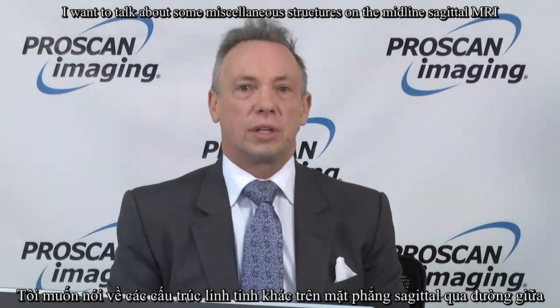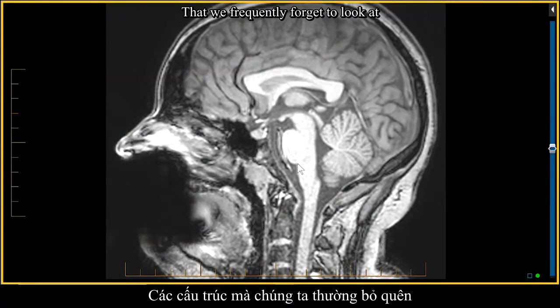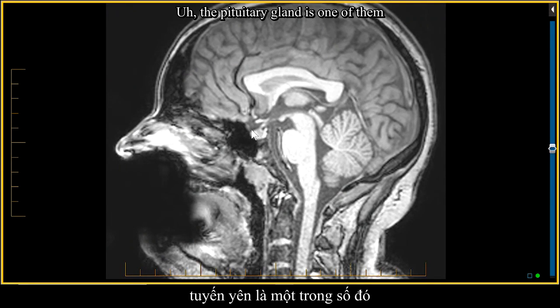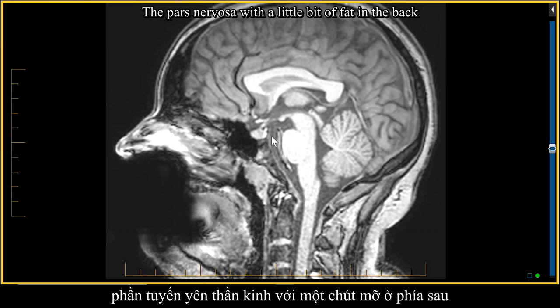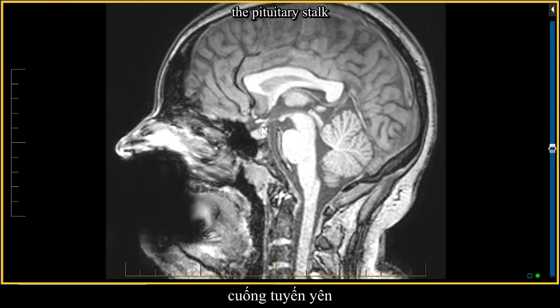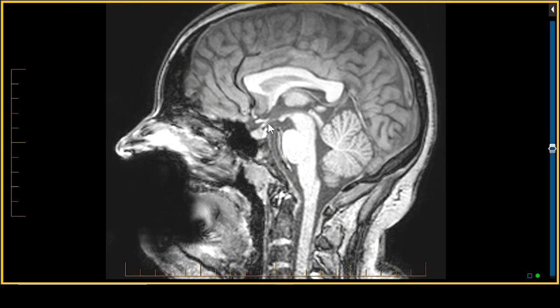I want to talk about some miscellaneous structures on the midline sagittal MR that we frequently forget to look at. The pituitary gland is one of them. We've got the adenohypophysis, or pars distalis, and pars intermedia right there. The pars nervosa with a little bit of fat in the back. The pituitary stalk, or pituitary infundibulum, and the median eminence as it comes up and fans out a little bit.